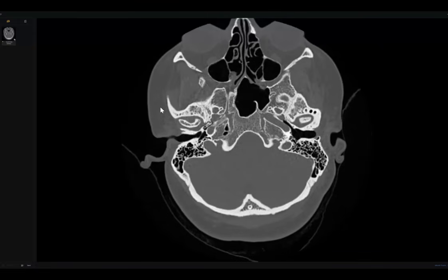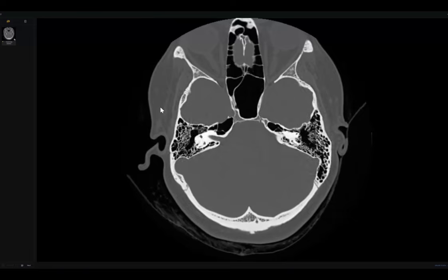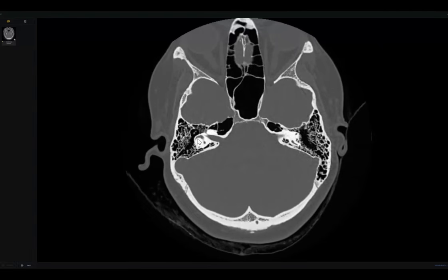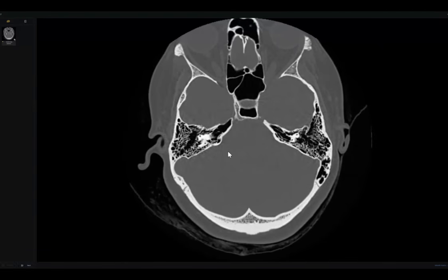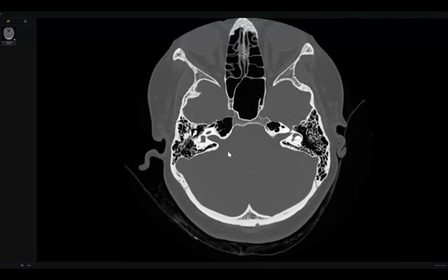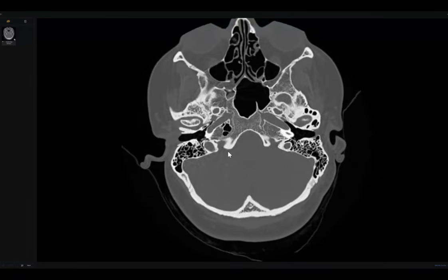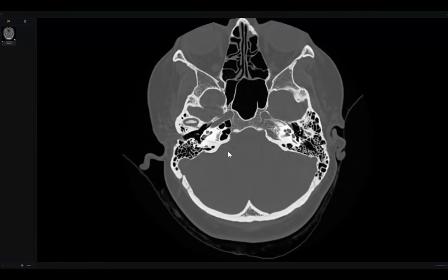She did very well in the beginning when she talked about the Meckel's cave. By the way, no bony erosion would be related to the trigeminal. Until this point you were very right. Then I changed the complaint to a facial weakness.